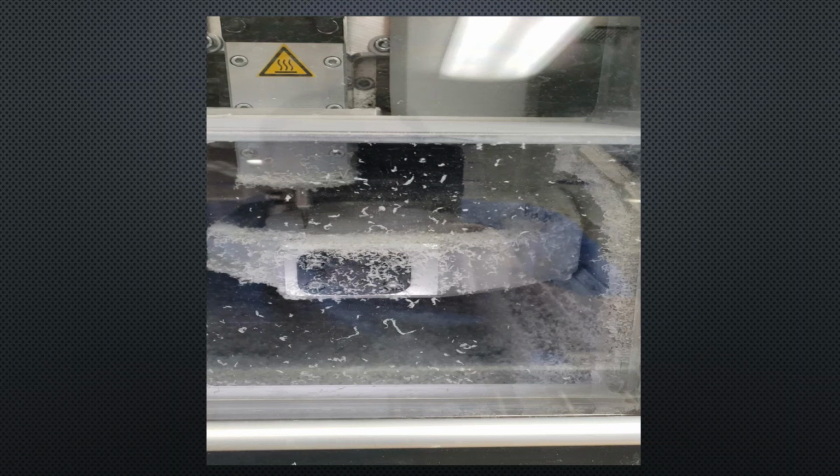Never had an issue. Where I have seen an issue is with some mills. They have a docking space that's just kind of a magnet. It sets the tool up in a little cradle, and it's a magnet. And the one machine I saw wasn't really exactly set up right. It was set up to central vac from the lab, which central vac isn't a positive vacuum, as you know, or if you've ever experienced, they have trap doors at each bench, and you can shut it, and it just lets the vacuum go somewhere else because it serves multiple positions. Well, that's kind of what happens.